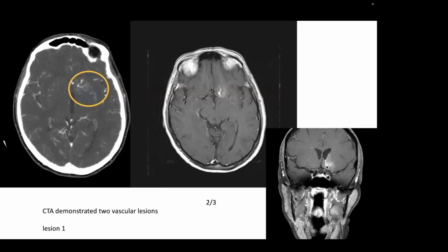DVA, yes. This is probably a telangiectasia and a DVA, definitely a DVA, right? We have enhancing branching vessels with a single draining vein that goes to the margin of the ventricle. So even though it's a little odd looking, from just a description of the findings, this is a typical appearance of a developmental anomaly.